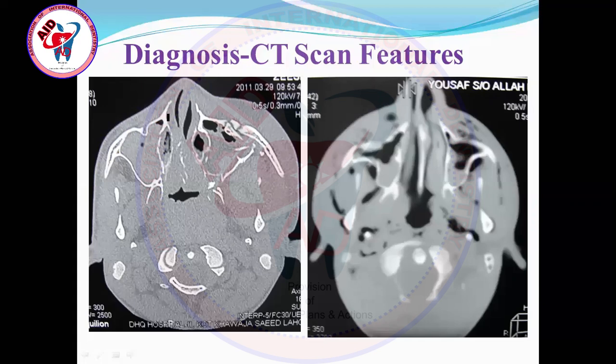This is the lateral wall of the nose. This is the nasal septum, or the mid of the nose. And clearly here is the tip of the nose. These are the lateral aspects of the dorsum of the nose. Here is the nasal septum, and on the sides these are the nasal cavities. Because this section is at a somewhat superior level, the nasal cavities are not so broad. Posteriorly, these are the posterior nares, and this is the nasopharynx posteriorly.